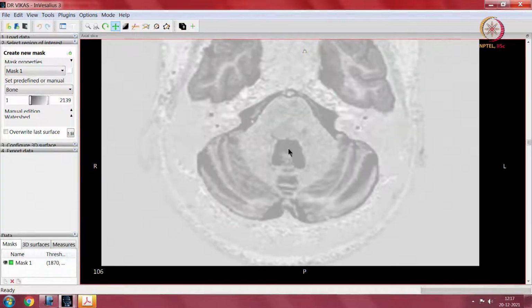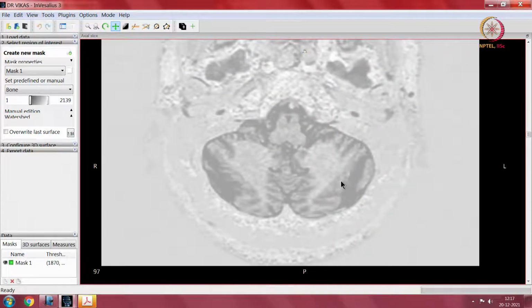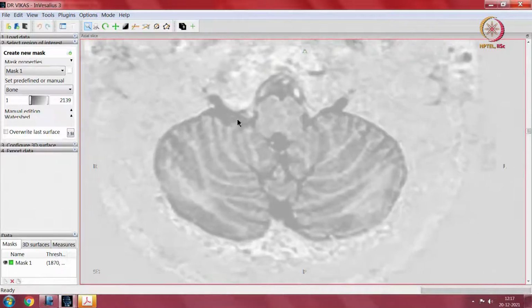So, this whole stuff is the brainstem, and you can make out that there are no distinct boundaries between brainstem and cerebellum, because the brainstem and the cerebellum communicate through things called the peduncles. So, this is the communication between the brainstem and the cerebellum through the peduncles. Now, again going back to what I had taught you earlier, how do you recognize various parts of the brainstem?